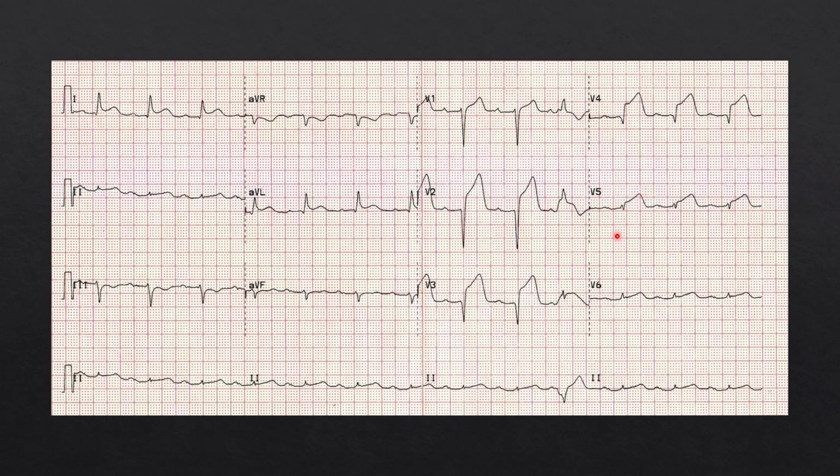This is actually called the shark fin presentation, not to be confused with shark finning in a capnogram, which indicates bronchospasm. This is shark finning on the ECG, which is an ominous sign of an acute MI patient. So this would be a LAD occlusion.